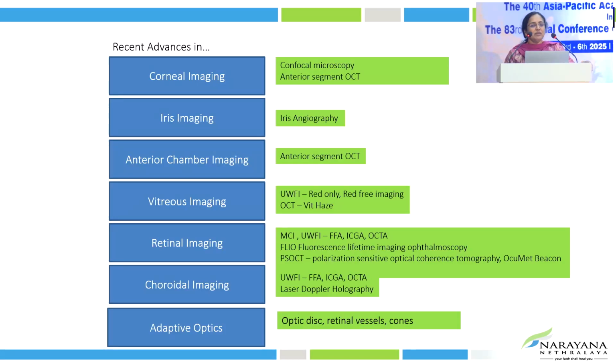In OCT, we have polarization sensitive optical coherence tomography, called PS-OCT. It measures the functional ability of the tissue. Whatever anatomical details we see is with the OCT, while PS-OCT measures the functional aspects. It measures birefringence, and collagen mapping can also be done with it.